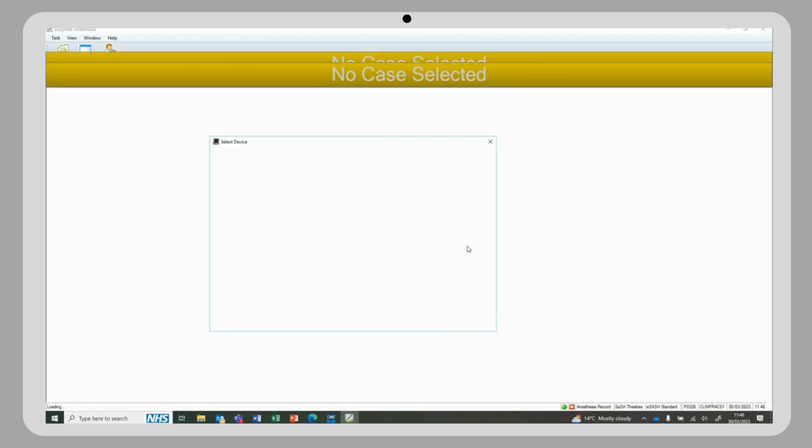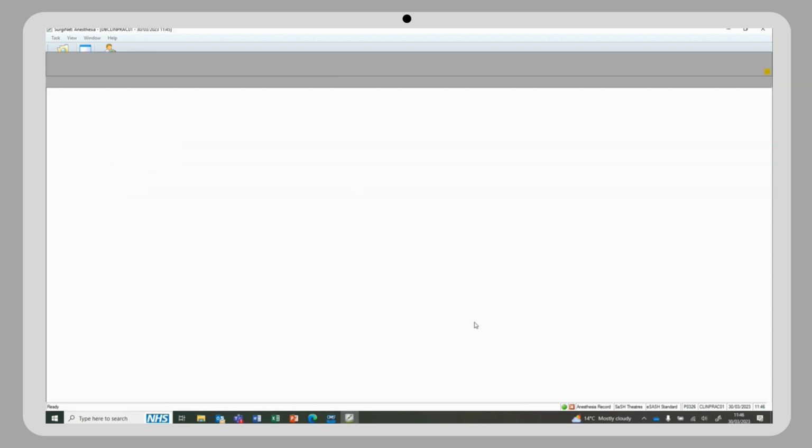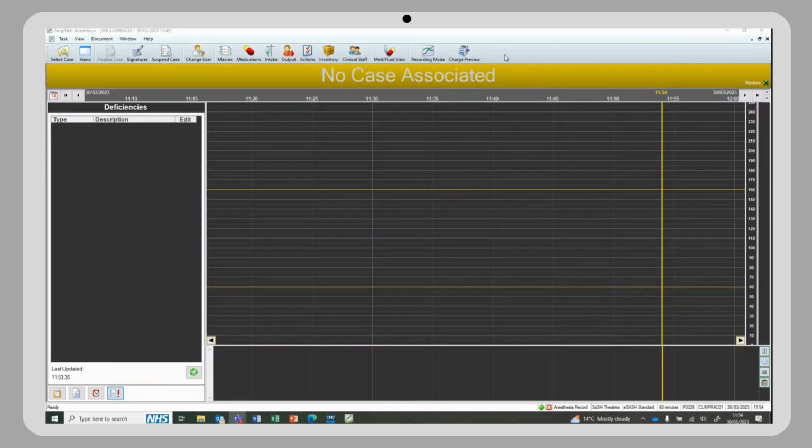Select OK. And now you'll see the select device screen. You'll get used to seeing this screen every time you launch SA. For the purpose of this video, we'll select cancel because we're just setting up. So now this is your anaesthetic chart and we can start customizing.